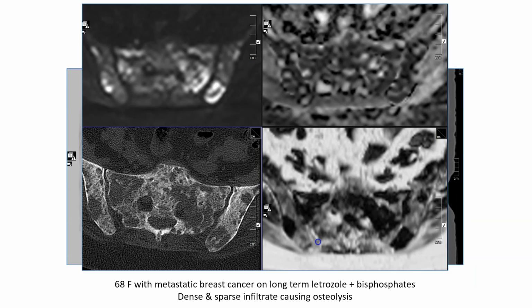And here's another example of a patient with breast cancer. You'll see major areas of osteolysis in both the sacrum and in the posterior part of the iliac bones. In this osteolytic lesion here, we've got a little bit of bone, which we see over here. So this is highly cellular, associated with osteolysis. Whereas if you look over here at this metastatic deposit, you'll notice that there are two areas here which are hypercellular, but the rest of this metastasis is not hypercellular.